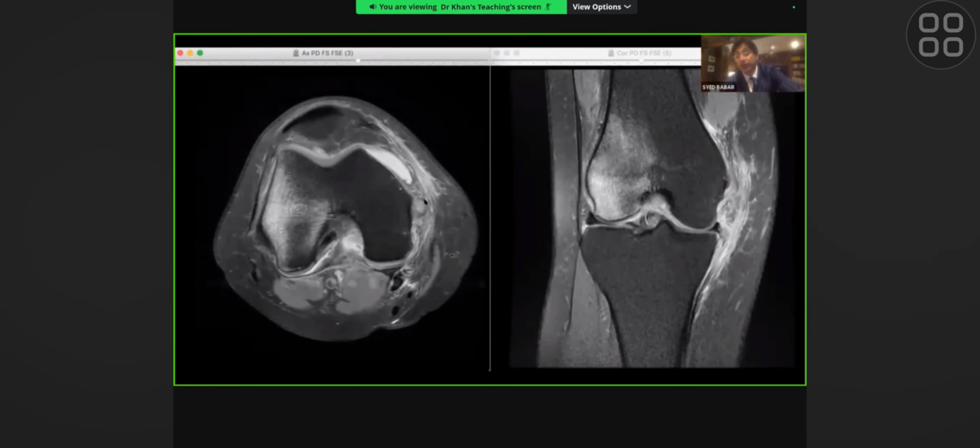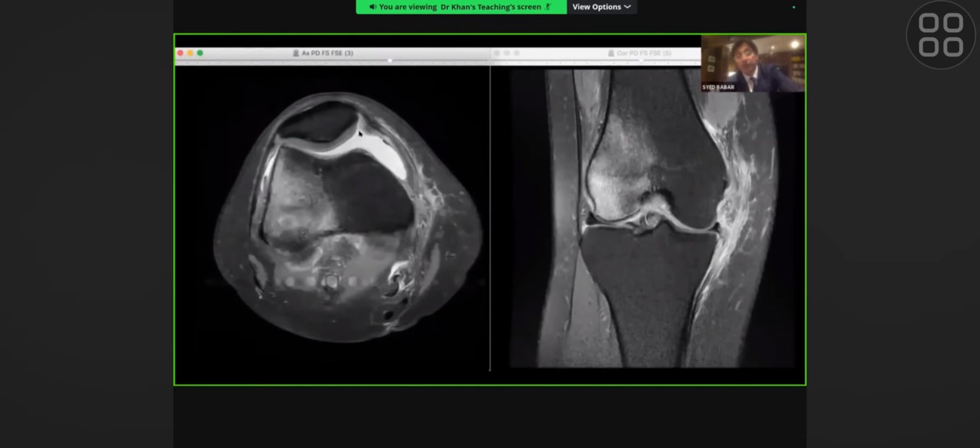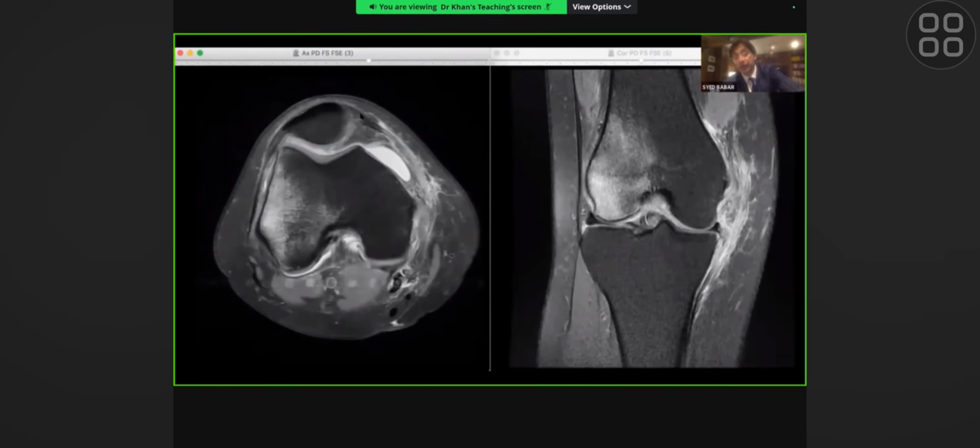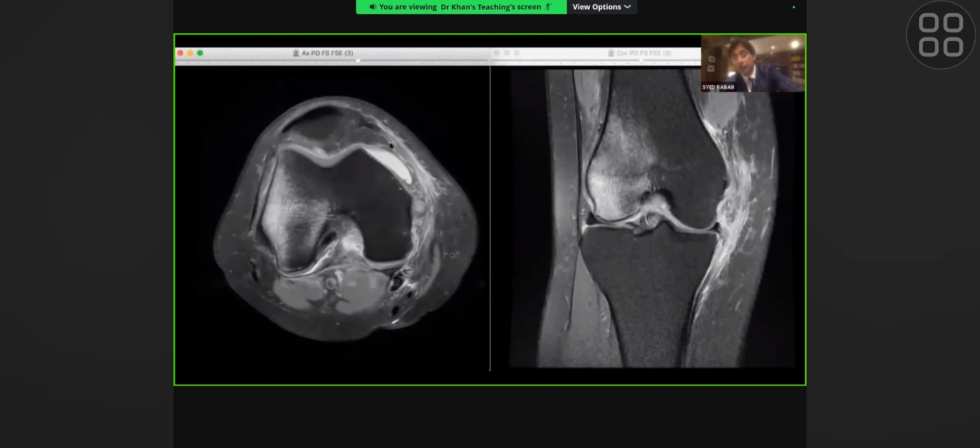So this knee is unstable. And this knee is unstable because there's nothing on the medial side protecting it. All of it is disrupted. And of course, the patient is lucky because the patella has not gone all the way on the other side, because there are probably still medial patelloretinaculum fibers holding it, because the MPFL is not completely torn, it's partially torn. So immediately you can see, just bringing the three sequences, you've pretty much managed the whole case.